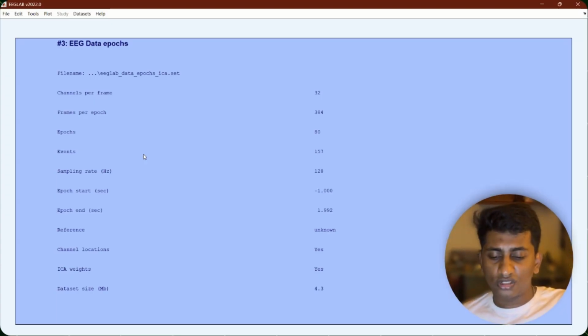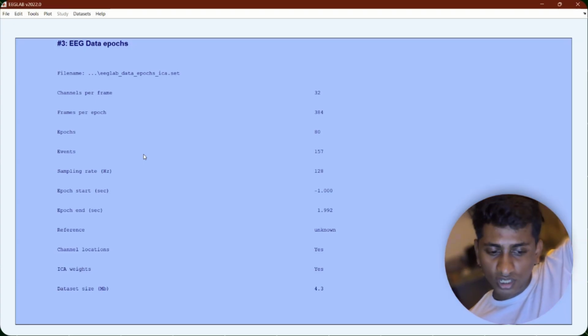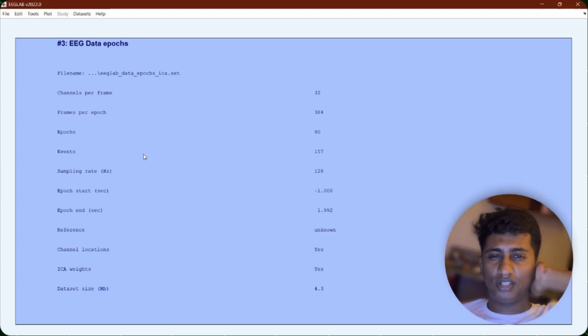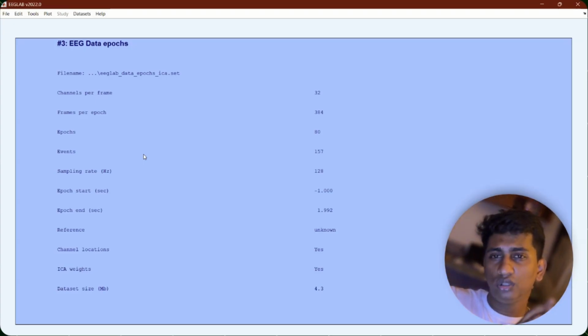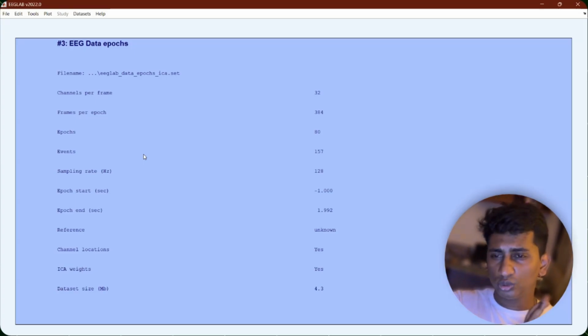And always we need to check the EEG srate and EEG nbchan, the downstream parameters. It depends on fs and the number of channels. If fs were around 250 or 1000, then we should scale the filter window and transition bands proportionally. The sampling theorem remains: fs is greater than or equal to 2 times fmax.